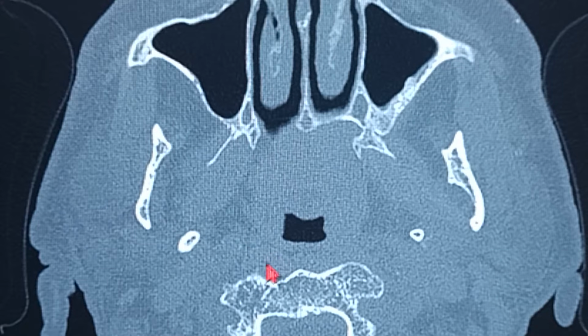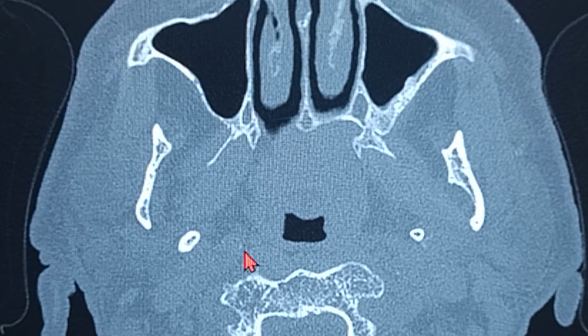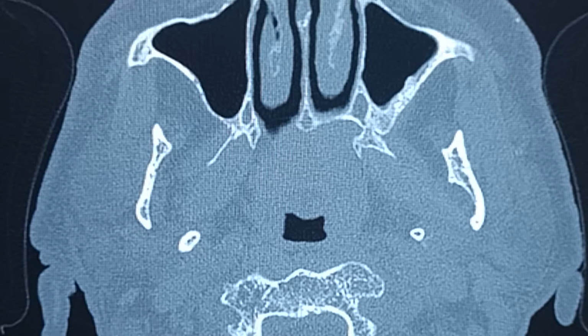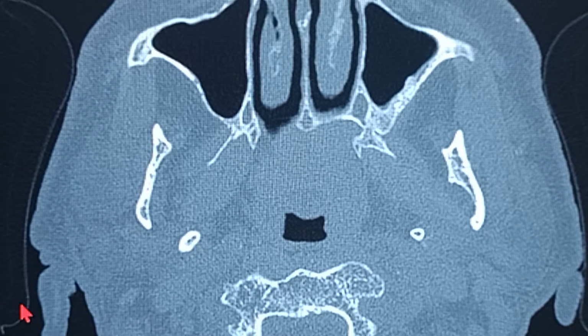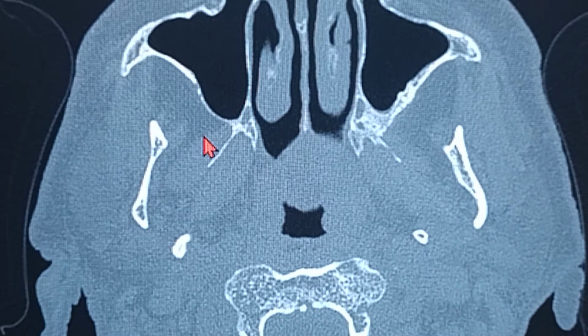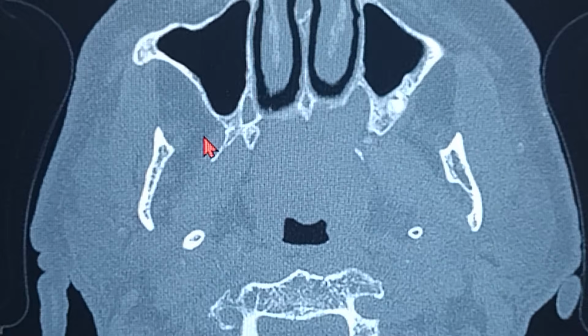So first point, if you're taking a HRCT of a patient, always ask for a proper thickness. Now this scan has a thickness of around 0.7 mm. I can see it on the screen. I don't know if you guys can see, but it's showing 0.7 mm to me here. So the thickness for you to understand all these structures is basically 0.7 on this scan. It should be 0.5 to 1 mm basically.